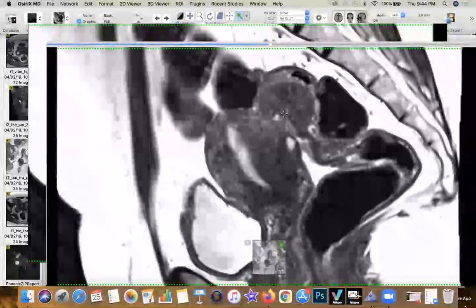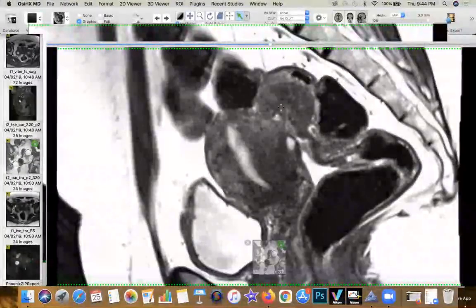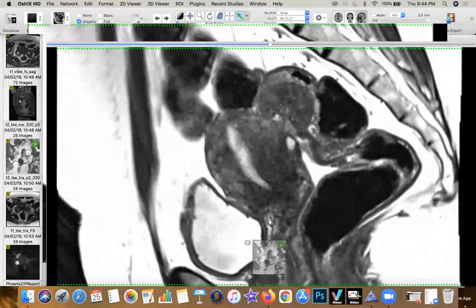What are the other points you've got to remember? Whenever you see rectal wall infiltration, you've got to measure the maximum thickness and the maximum length of the lesion. Usually a cutoff, I think, is about 2 centimeters when you're looking at the size or the thickness of the lesion. The second thing is the percentage of the circumference of the rectal wall it has actually infiltrated. As the lesion is eccentric, you've got to be very careful when you're measuring it. If the lesion is less than 30% of the rectal circumference, you can get away with a partial excision of that portion of the rectum. By and large, if it's more than 30%, you will require a resection and anastomosis of the entire segment, to maintain functional continuity with the anal canal itself.